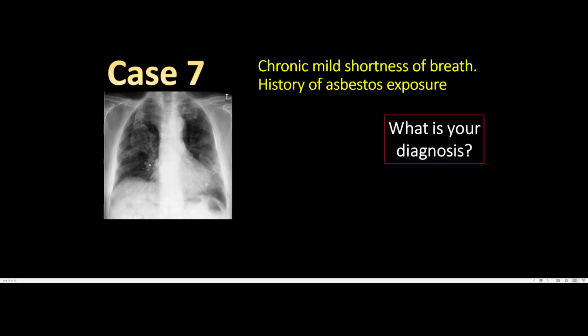And again, when you have asbestosis, you have it in the case of interstitial lung disease. Here in this case, we have a person with interstitial lung disease that is so severe with the presence of pleural plaques. They're large in appearance in this area, and you can find it in this area, and you can also find it in this area. So this guy, he has asbestosis with mesothelioma, which presents in the form of intrapleural plaques.